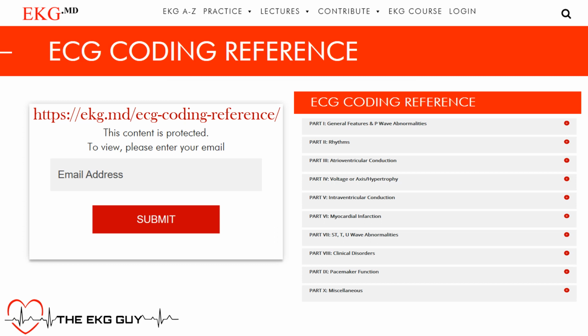So we've been going through our EKG coding reference guide that we've now made available online. And where we are is in the ventricular rhythms section, okay? And today we're going to look at ventricular escape beats or ventricular escape complexes, okay? And that's under this rhythms section, part 2.